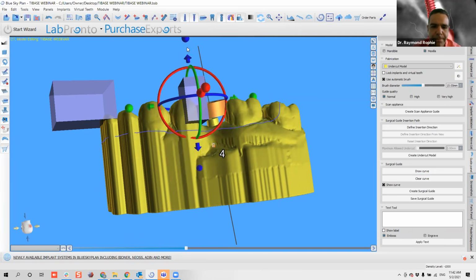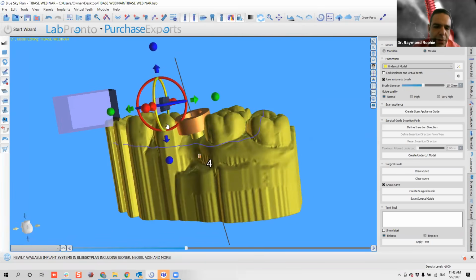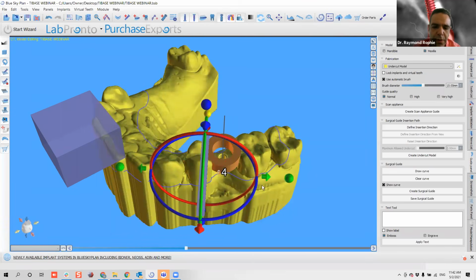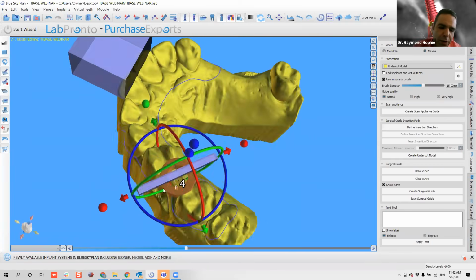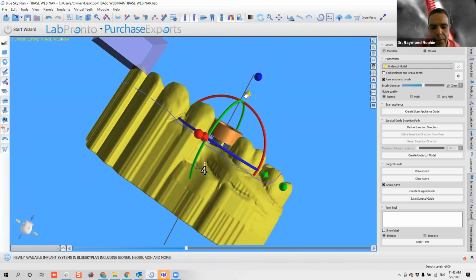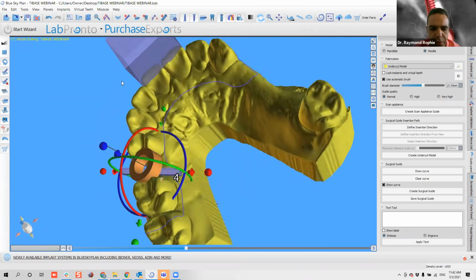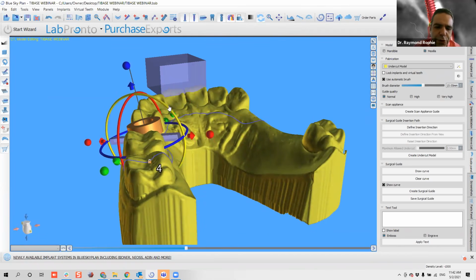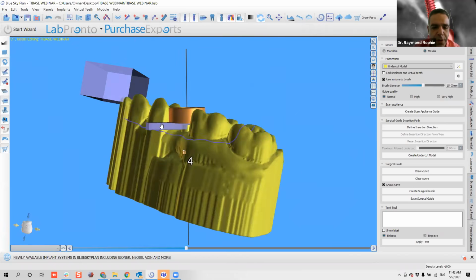You can create a very narrow window, make it protrude, and position it within the long axis of the implant below the guide tube. After you position the sleeve, you can create two holes. One hole will be for injecting water and the other hole will be for positioning the suction. So you can create a flow, and that's it.